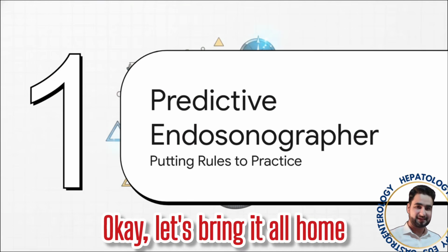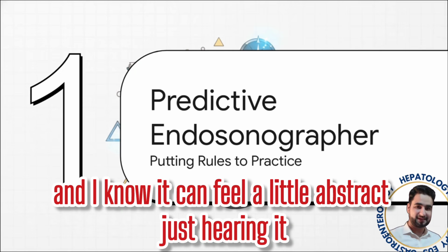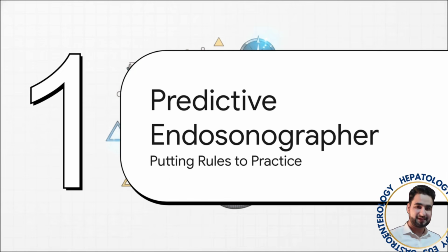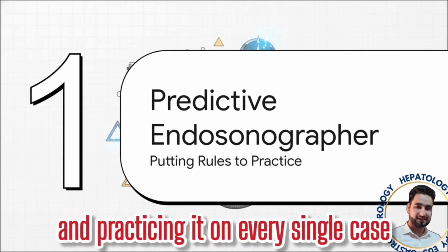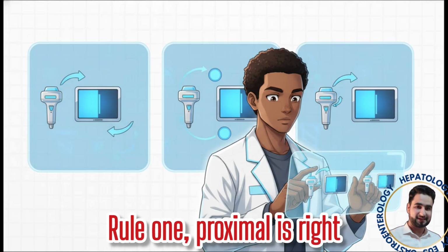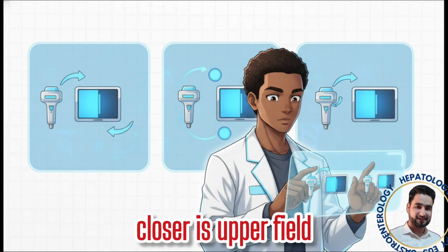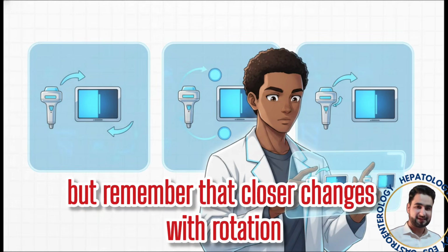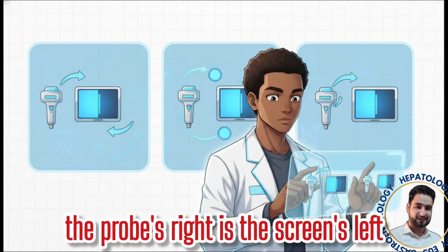Okay, let's bring it all home. We've gone through 3 rules, and I know it can feel a little abstract just hearing it. That's totally normal. The only way this becomes second nature is by consciously thinking about it and practicing it on every single case. Here they are, all in one place, your new mantra. Rule 1, proximal is right, distal is left. Rule 2, closer is upper field, but remember that closer changes with rotation. And Rule 3, the probe's right is the screen's left.